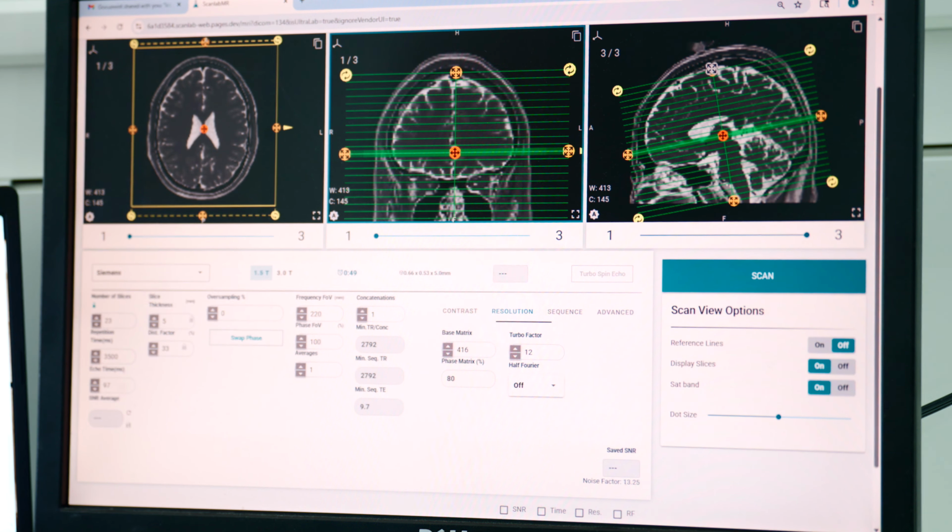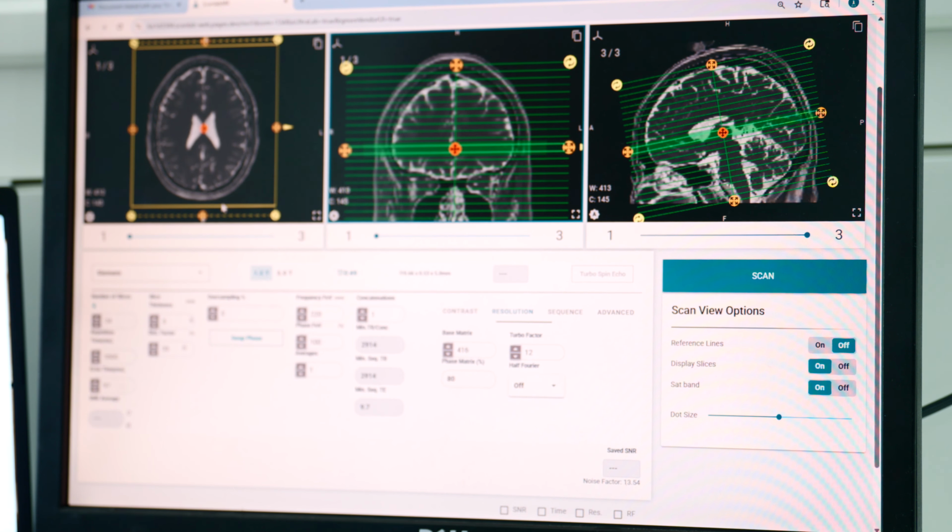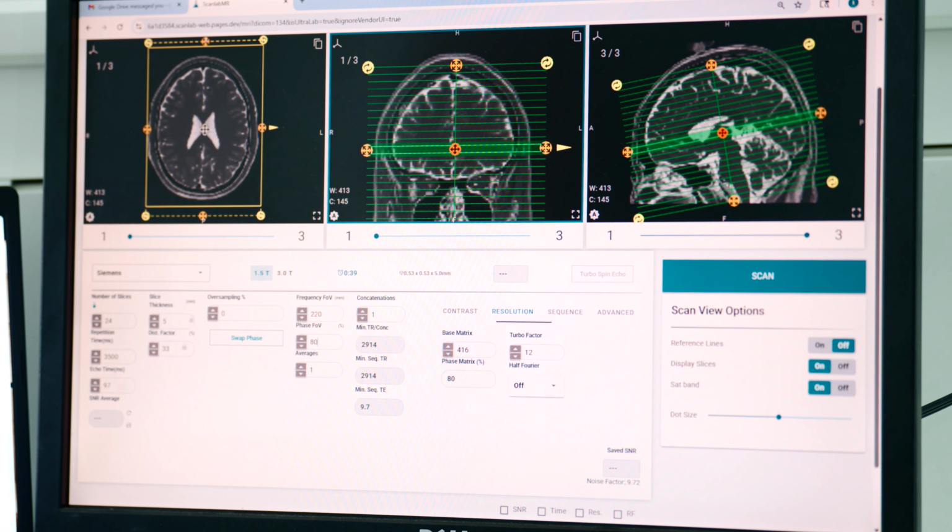And so I'm at 1.5, and in this case, I'm going to add some more slices here. Perfect. Now, later on, in real life, in practice, I can go through and say, well, retrospectively, that was not a very good decision. I had to repeat the study, had to repeat the sequence. That's not what we really want to do.